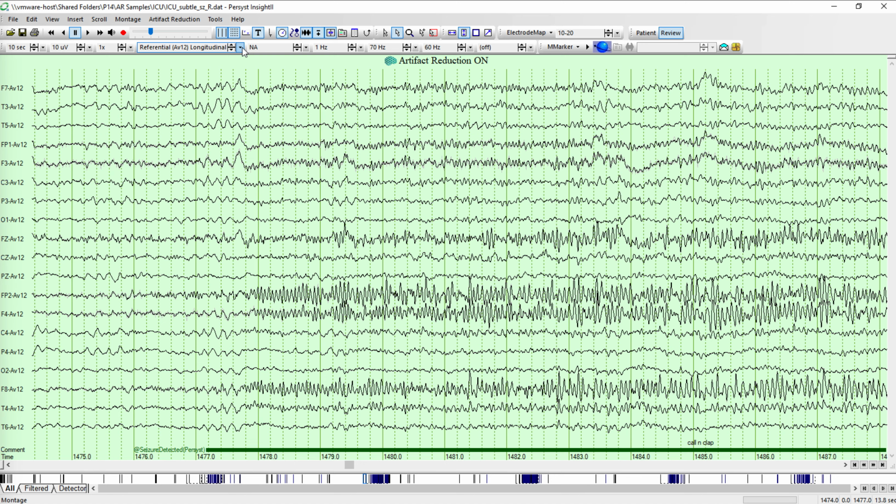used because they're incredibly difficult to interpret, just as if you were using a topographic map for hiking, and instead of height above sea level, it was referencing to every other point on the mountain. For each point, it would be pretty much impossible to make sense of. It would be correct for what it was representing, but we couldn't make any sense out of it. So same thing with mapping and EEG, topographic mapping. And this is going to be frequency mapping, but you can do voltage mapping as well, of course.